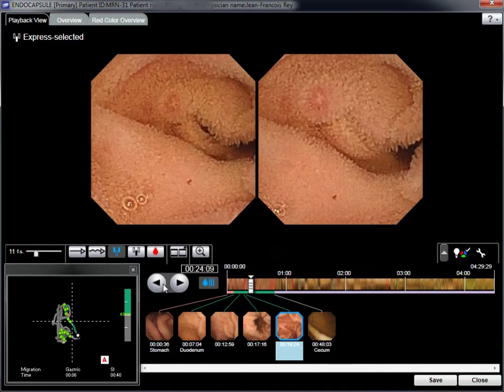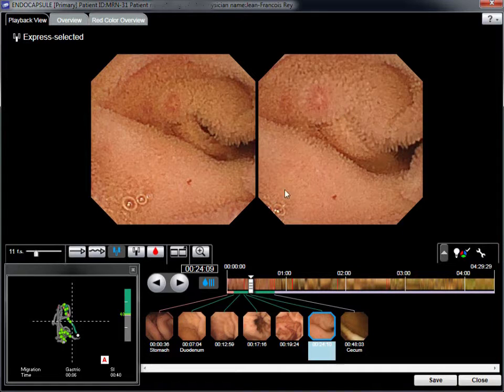These limited abnormalities require attentive reading. Often it is wise to stop reading after 10 minutes in order to avoid loss of concentration, as review of multiple images can be boring.